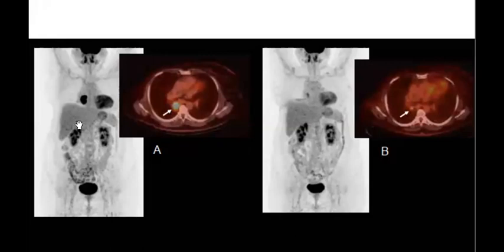If it is a lung or pulmonary lesion, whatever, it is the same, it will be regression. If it is a metastatic pulmonary nodule, yes. So what happened here is that he wants to show you that this patient took treatment or retook treatment, and after that he had regression after taking the treatment, right? Okay, easy, is it easy?